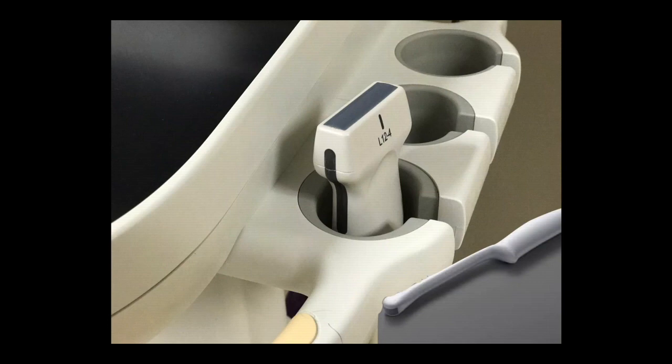If, for instance, you have a broken linear probe or vascular probe, or it's out of commission for whatever reason, it's being used and you really want to use something, you could also use an endocavitary probe. It's a very high frequency probe, a little awkward to hold given its length, but in a pinch you could definitely use this as well for something very superficial such as the eye.